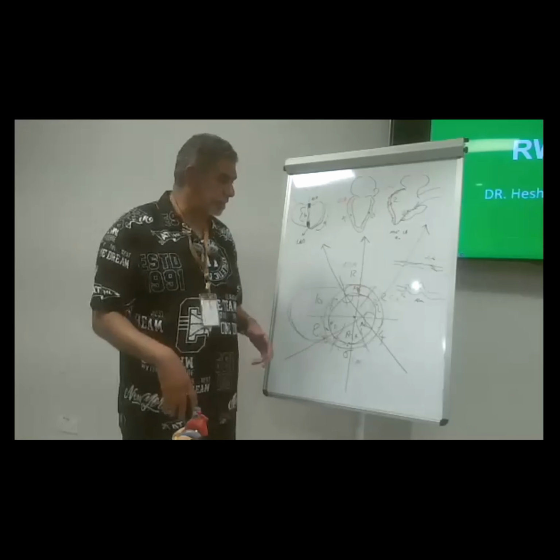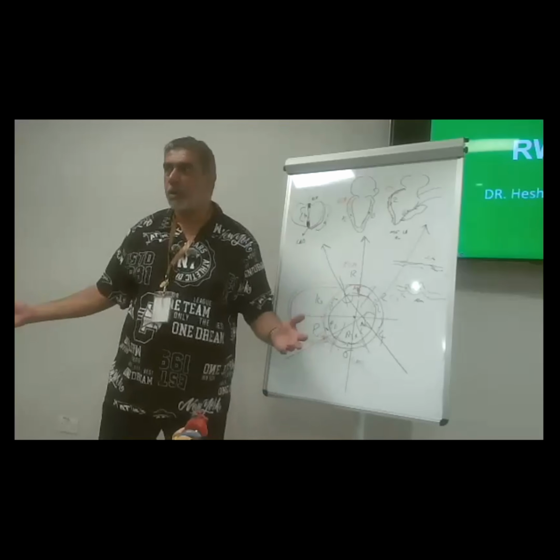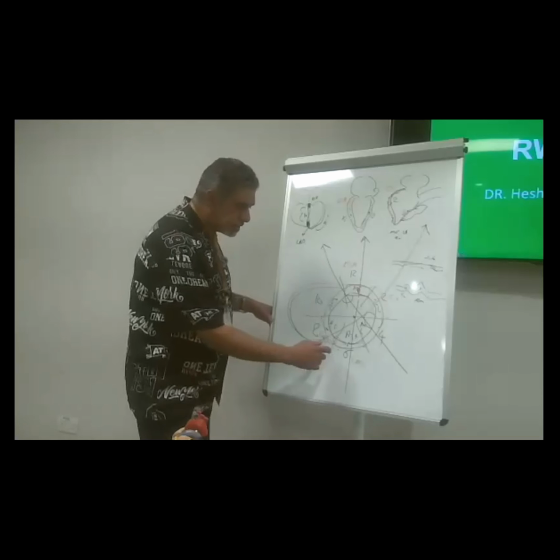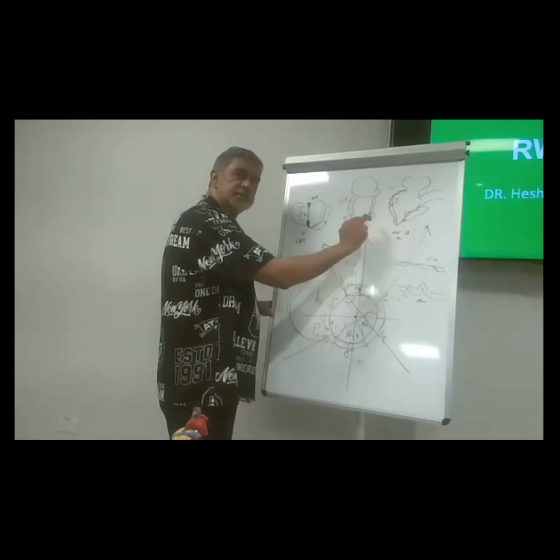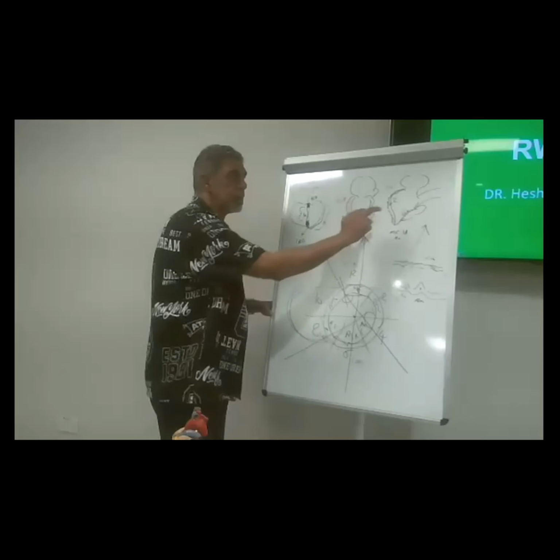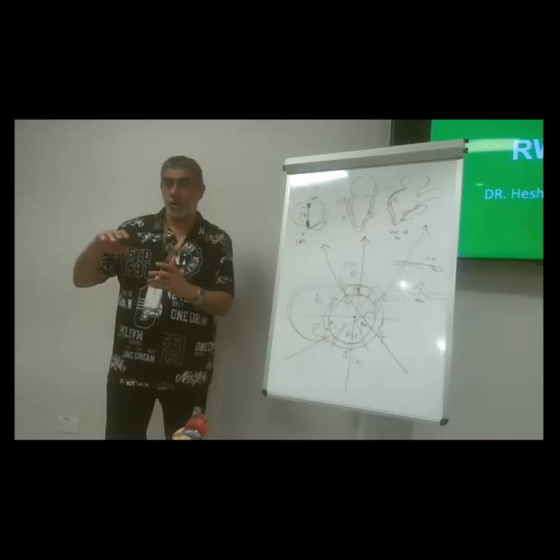The last example, because we take 1, 2, let's take those. CABG. Every day we have CABG. Come off bypass, and the patient is not good. We have a problem. You check, you find 6, 8, or both are hypokinetic, anterior and anteroseptal. I didn't get here, that's why I'm concentrating on these areas. 2, 12, 6, 8. You report this to the surgeon.